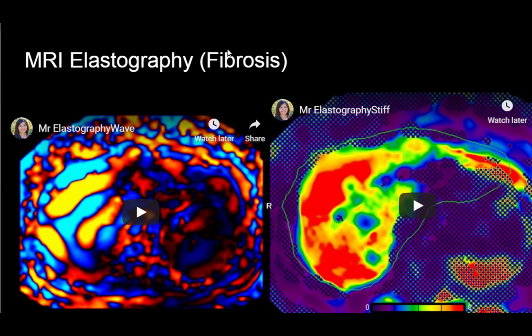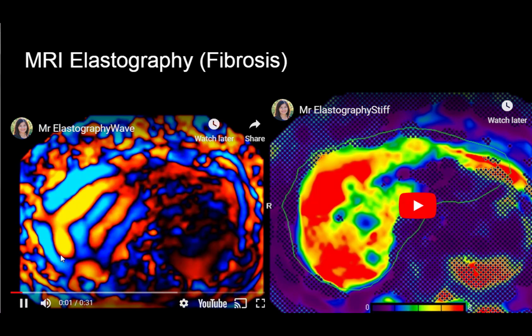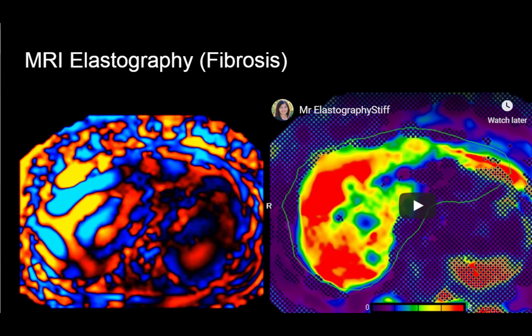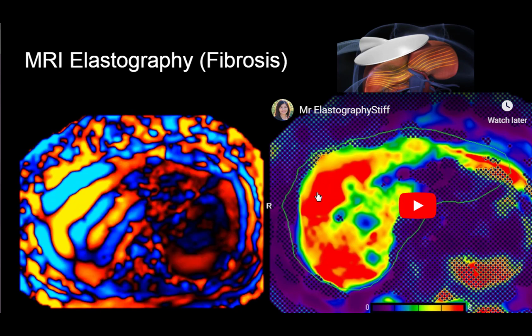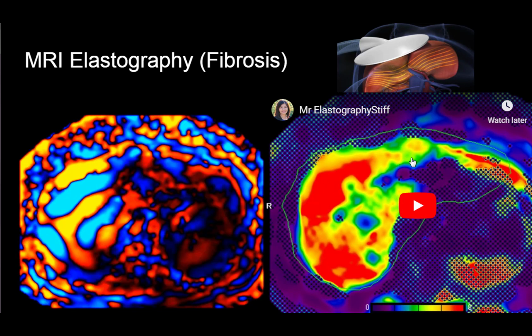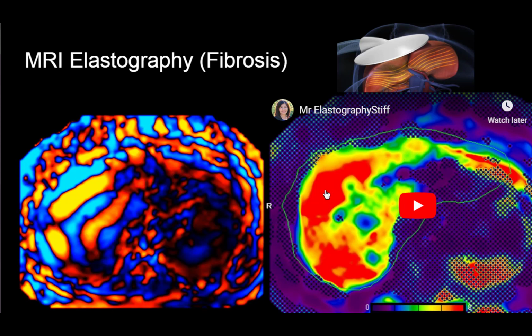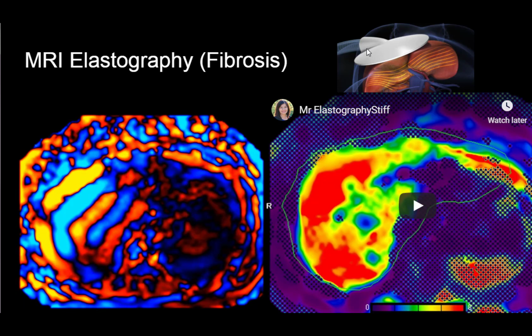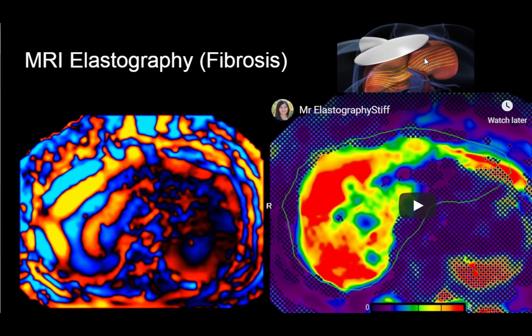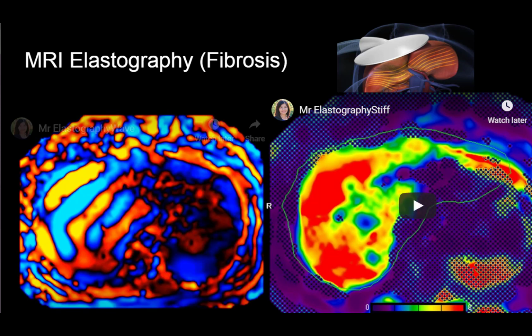This is an example of an MRI elastography to assess for fibrosis, cirrhosis, it's end-stage fibrosis. And so what we can do is send waves into the liver, and then we can assess the severity of the fibrosis. So the red suggests a cirrhosis, the blue and the green mean more mild F1, F2 versus red, which are F3, F4 fibrosis. And we can get these wave images by an external coupler that sends waves into the liver, and that helps us identify the severity of fibrosis.